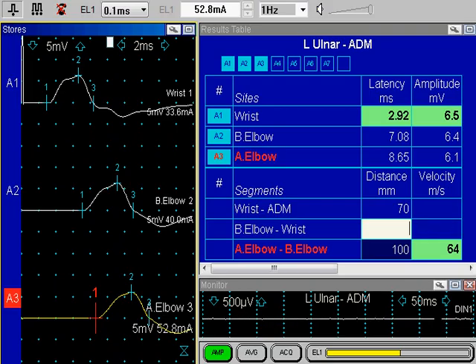Type the distance value and press the Enter key. Notice the highlight moves to the next cell in the distance column. One can push the distance key repeatedly to select the desired box and make any corrections or type in the distance value as necessary.